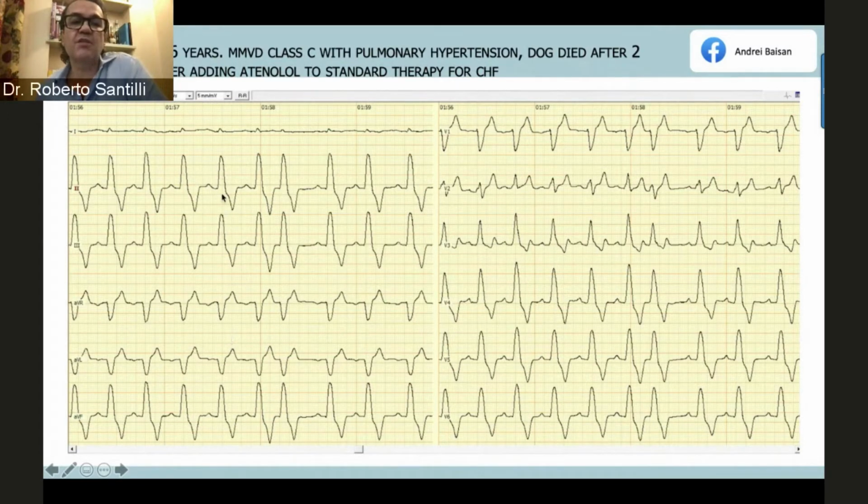Is this pre-divisional or truncular or post-divisional? Again, I can see a tiny Q wave that probably is the second vector. I cannot see a deep Q wave that is usually present when you have a normal first vector. So this is a pre-divisional left bundle branch block or truncular left bundle branch block. So remember, this is a bifascicular block.